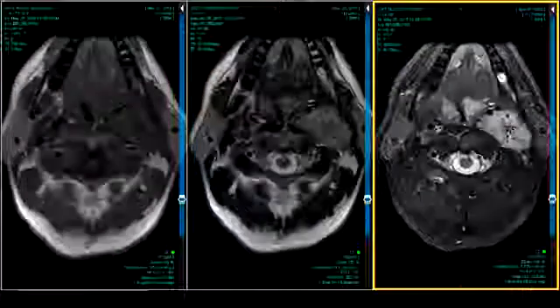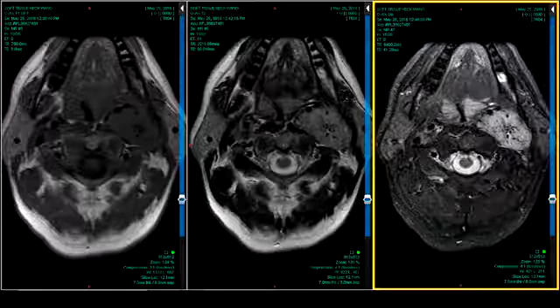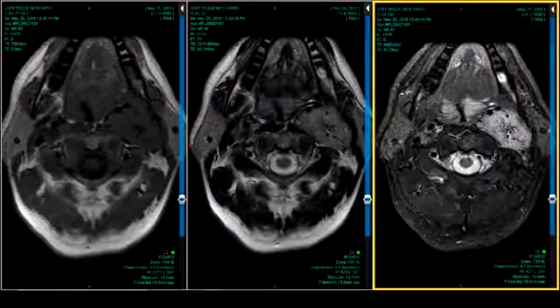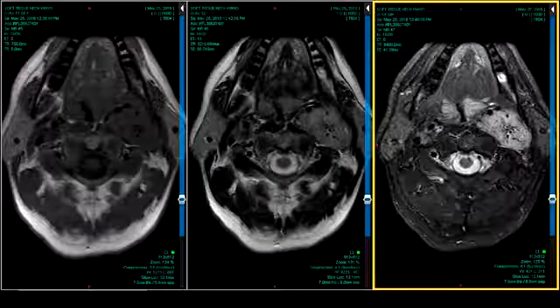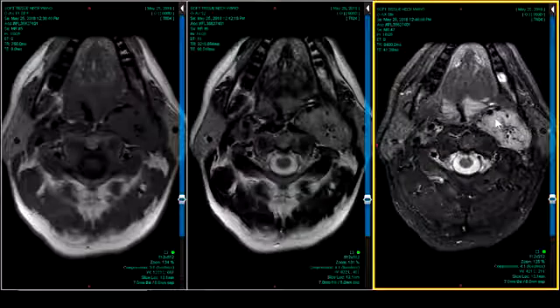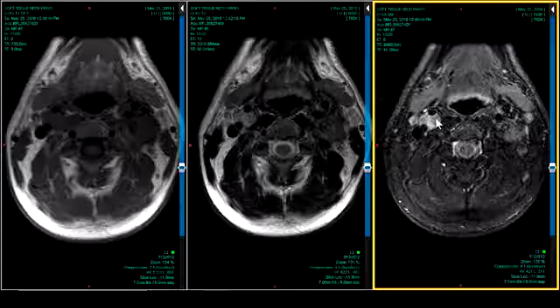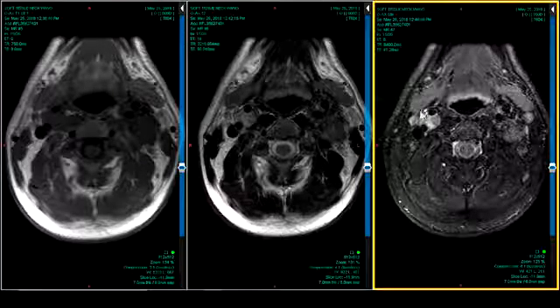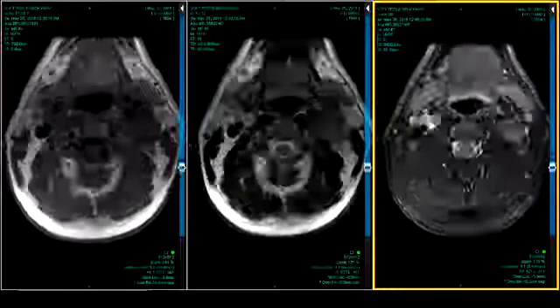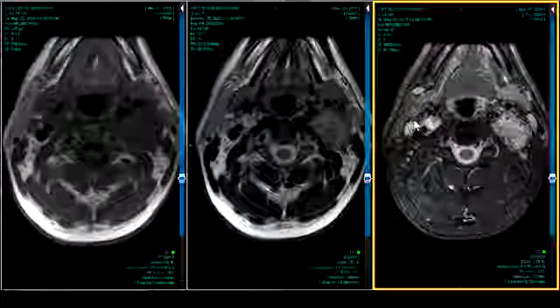And our large lesion, true to form, is somewhat hyperintense with exuberant internal vascularity. And Dr. Schupek's going to talk in a moment about what it's doing to the carotid circulation, which is relevant. But while we're at it, let's look at the other side. There's a lesion on the other side, and Dr. Schupek's going to talk about what it's doing to the carotid circulation on the opposite side. And there's more than one of them, or at least a daughter lesion next to it.